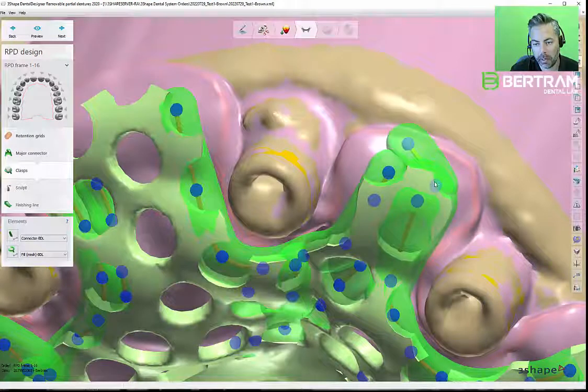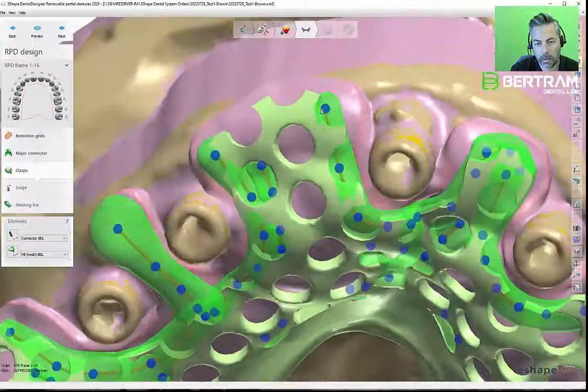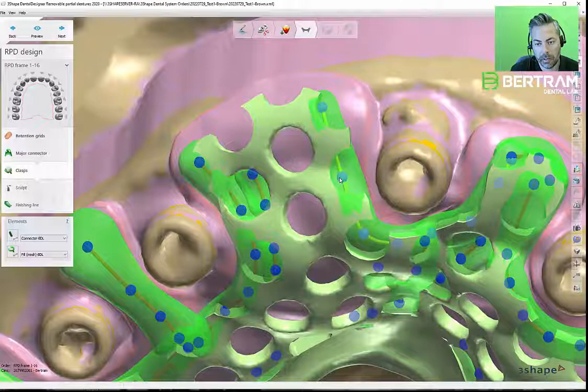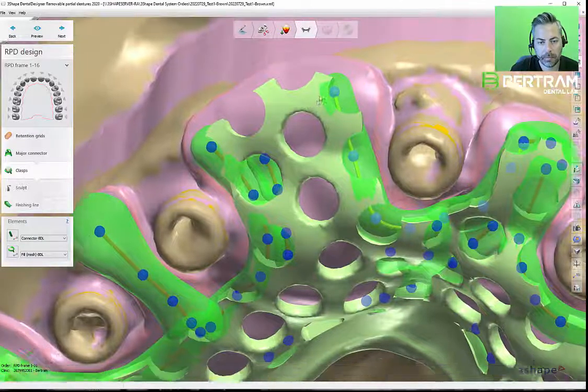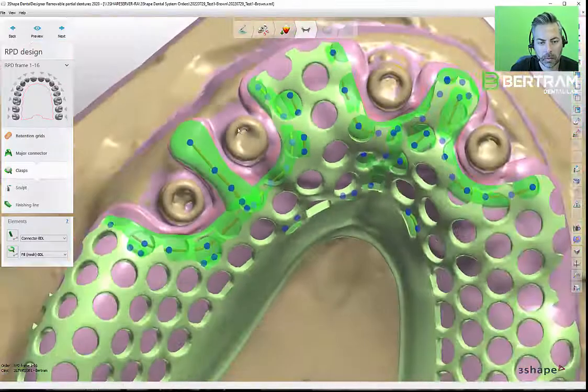Sometimes I'll do a part like this where you have two coming forward. And if I want a really clean edge, I'll do it like that. Or I can right click and put a spline in the middle like this. Kind of give it that curve. Again, this is getting really picky. Like that.